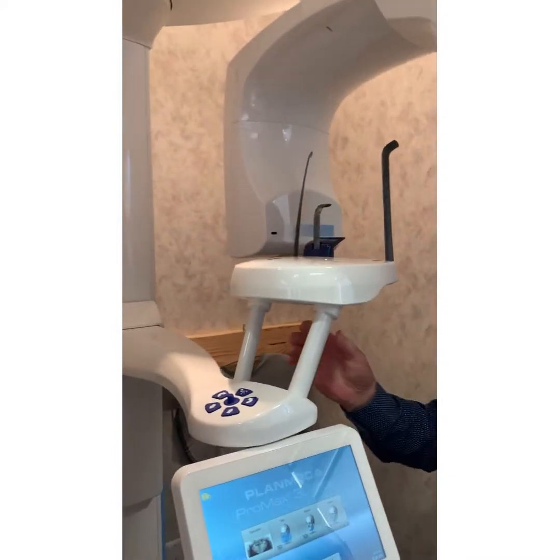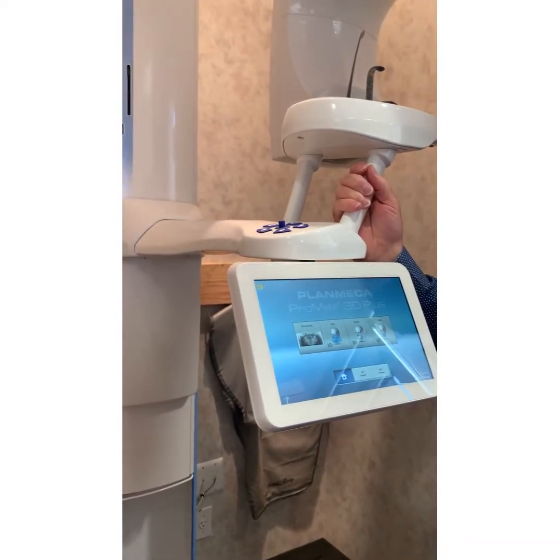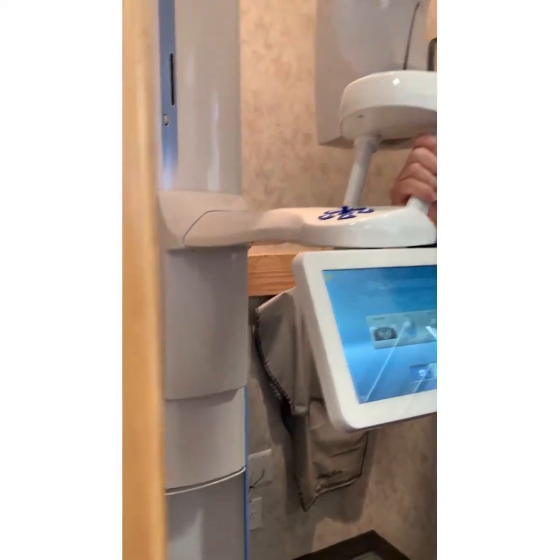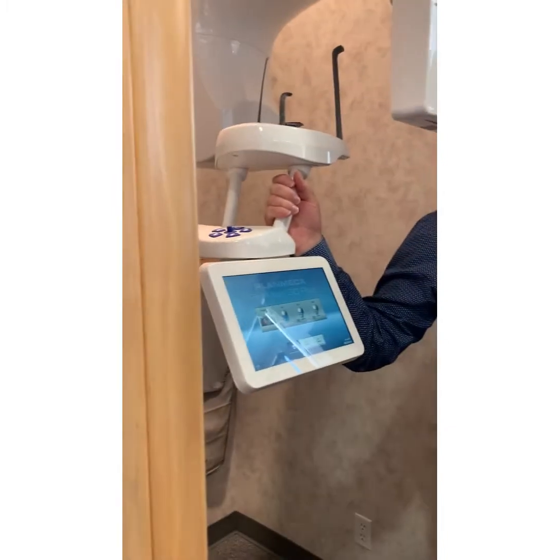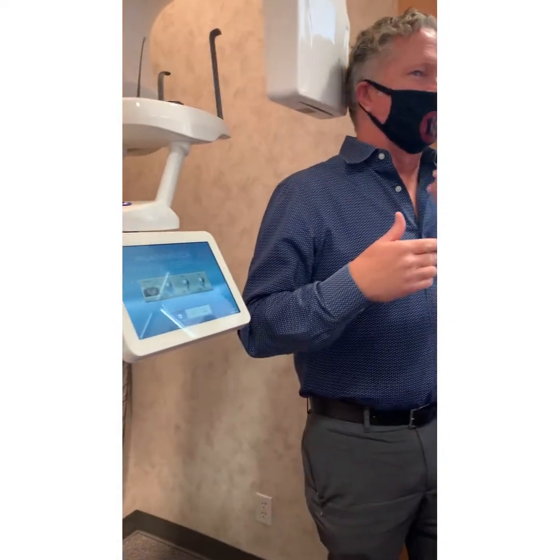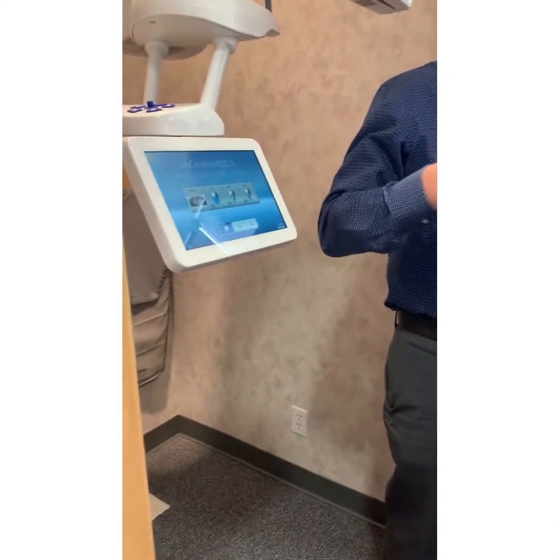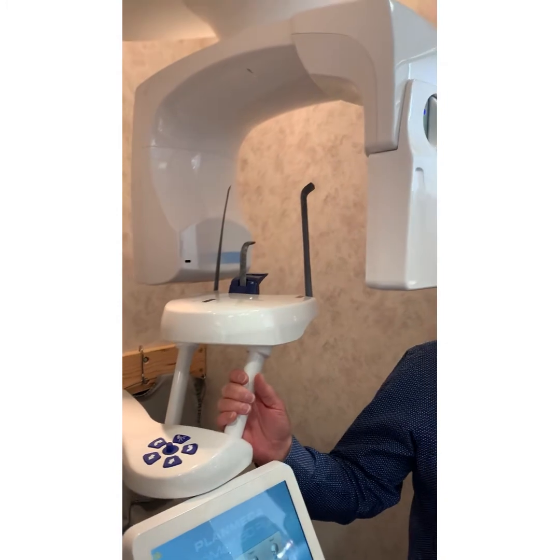So are you guys going to take everything into Romexis, or are you capturing your pans into something else? We have Dexys. They may have set it up. I don't remember how he set it up. Romexis is what you have to capture 3D into, but it's an all-encompassing software. You could capture your 2D, your 3D, your intraoral images, your photos, your STL scans from your scanner. All that stuff can be captured in Romexis. But many people, if they start out using Dexys or Dolphin or something else, that's what they're used to, and then you can take the 2D pan portion into that software, and that's probably how they set it up.